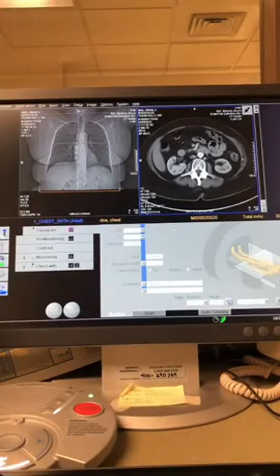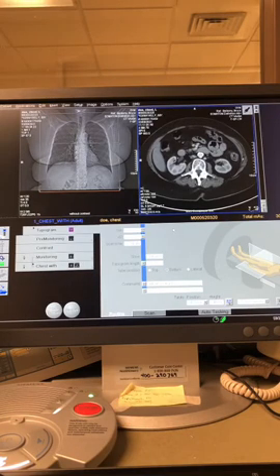So here we go. Let's talk through some normal chest. We're going to start with the most common, a chest with contrast. This is an anonymized scan. It's a real scan, and we'll start as if we were going to do it. If you reference the first video I shot on the neuro stuff, you'll remember Claire was going in feet first, supine, and we were putting our inside laser light above the apices, just mid neck, like C4, like for a cervical spine X-ray.